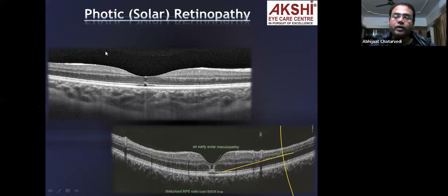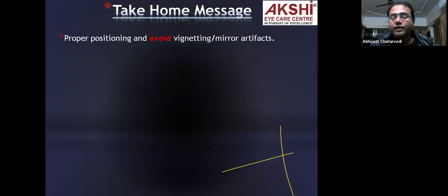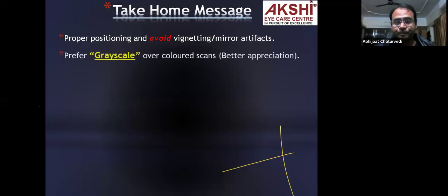So that was the beauty of OCT, that I was able to make a diagnosis which looked pretty normal to me on the fundus imaging. Okay. So what is my take home message? Always do a proper positioning. Avoid any sort of artifacts, be it in the form of vignetting or in the form of mirroring. Never ever cross the zero delay line, because that will cause mirroring, and because of that you might very well make a false diagnosis, especially in high myopic cases.